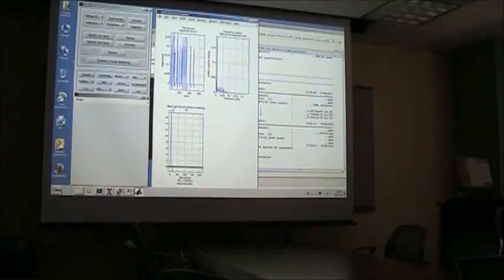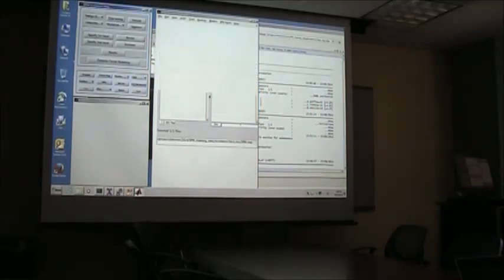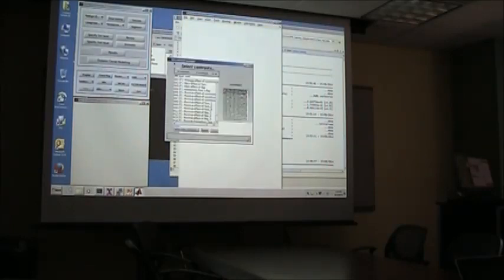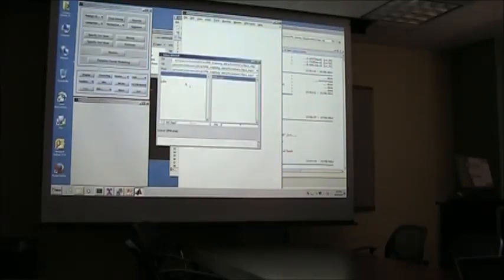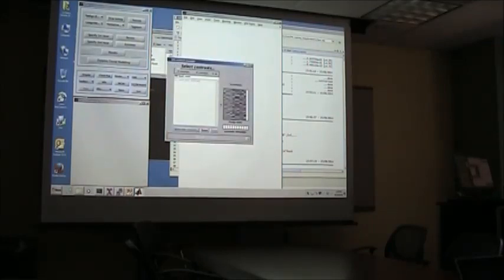So now we've set up the model and estimated the model. Now I'm going to look at the results of the model that we just ran. Again, this is just for one subject, right? There's nothing on the group level.